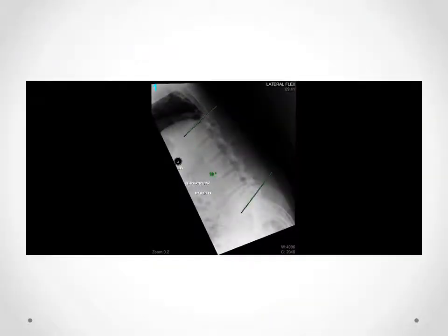So here is the flexion radiograph. It's an excellent radiograph. I can see all the structures, including trabeculae of the lumbar spine vertebra. And measuring from the superior end plate of L1 to the superior end plate of S1, I see that the lumbar lordosis angle is -10 degrees. Now recall that when we started on the neutral lateral film, the lumbar lordosis was minus 60 degrees.